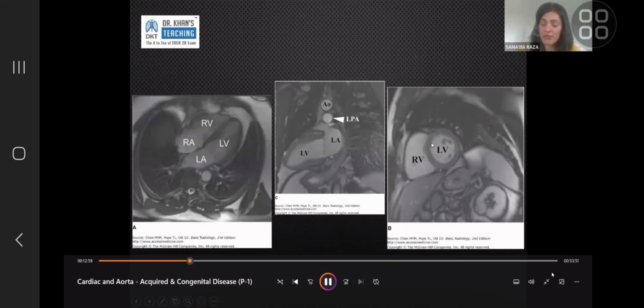This matters when it's asymmetrically thickened. When there's asymmetrical hypertrophic cardiomyopathy, it usually favors that area. It usually favors the septum or a specific area. When it's circumferential myocardial thickness increase, it doesn't really matter where you measure it, but you want to give the maximum value that you can find. And most commonly, it is found in that region. So that's why we measure it there. And we discount the fact that you're measuring the RV wall along with it. So you just measure it there and say that's the LV wall thickness.